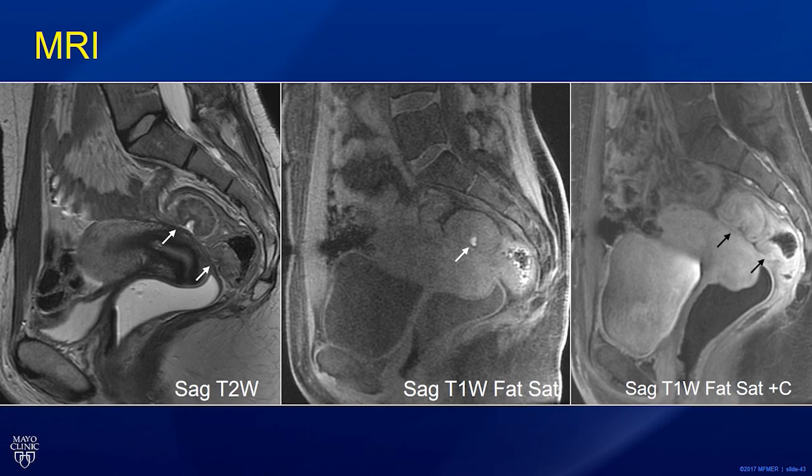We actually see two lesions that are T2 hypointense with hemorrhagic foci centrally and delayed enhancement. And of course, the MRI aids us tremendously for surgical planning because patients who have smaller lesions, so typically less than 3 centimeters, less than 50% of bowel circumference, and unifocal are amenable to a discoid resection. However, if lesions are larger in size, greater in circumference, or multifocal, patients then have to go to a bowel resection, so LAR or APR. So you can see here that this MRI finding will tremendously impact her surgical planning.